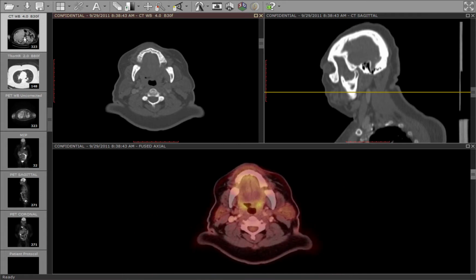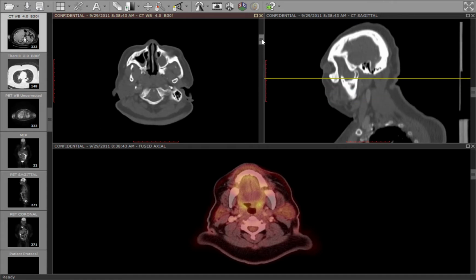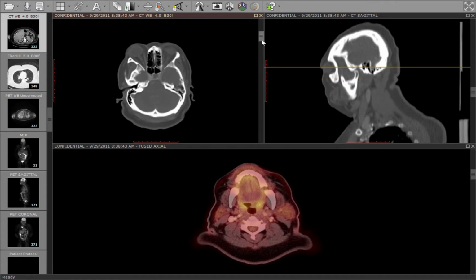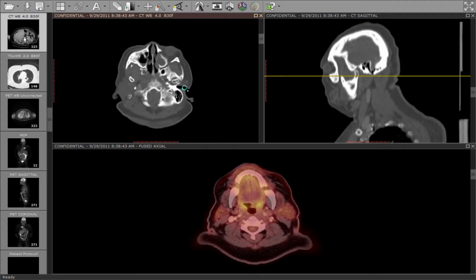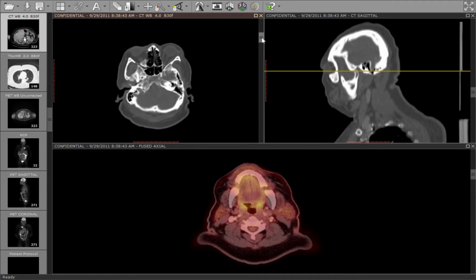One thing I noticed when I was looking at the CT scan, look at the upper left corner here, and I noticed that on the patient's left, let me scroll to it, you have the condyle right in the mandibular fossa where it should be. But on the patient's right side, let's see if I can get it. See how the condyle is kind of anterior? It's not centered within the glenoid fossa. And I thought that was kind of interesting.